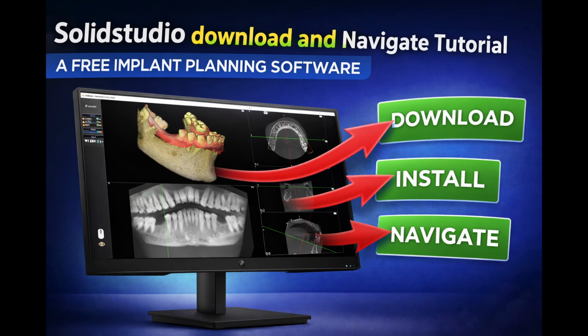Hello everyone! In this video, I'm going to show you how to download, install, and master the basic navigation of SolidStudio, your ultimate free software for CBCT implant planning.